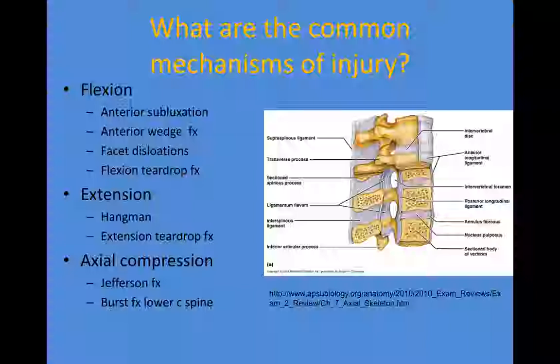And so sometimes you have to infer soft tissue injury by things like widening of the spinous processes back here that are normally held in tight position by the interspinous ligament. And when you tear this or tear the ligamentum flavum, you can have splaying of these, but you're not going to see that on a radiograph.